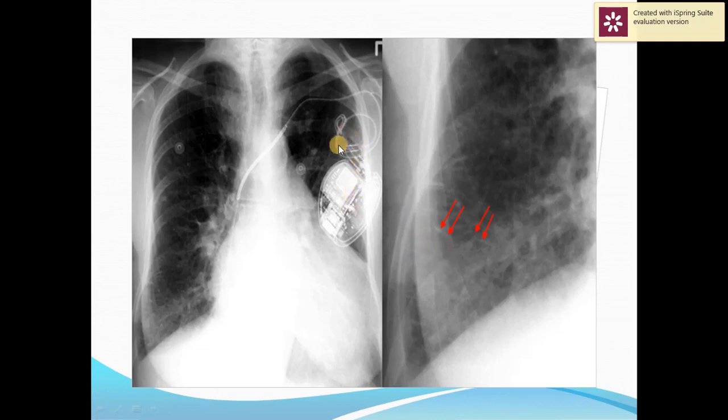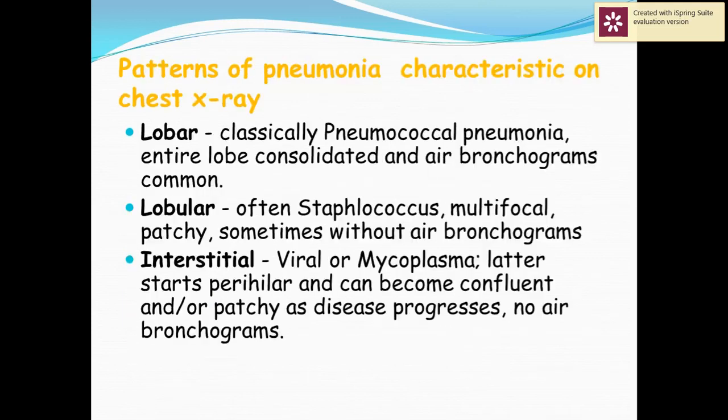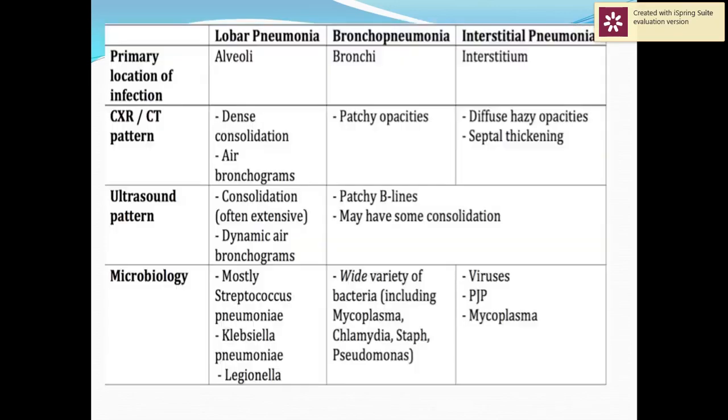As we see here, the pacemaker and the lead of the pacemaker. Pneumonia: airspace disease with consolidation, either it is lobar or lobular pneumonia or interstitial.